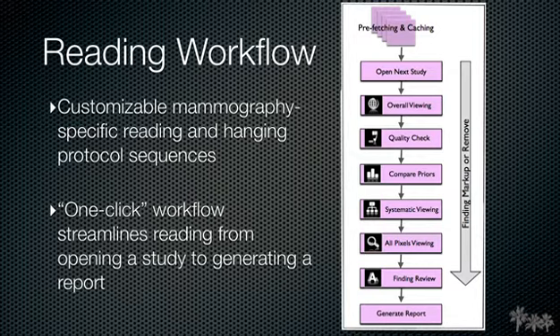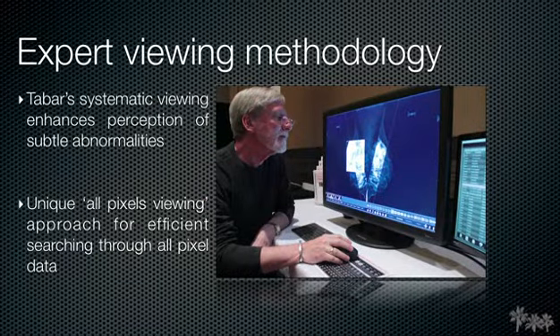WorkstationOne features customizable mammography-specific reading and hanging protocol sequences, as well as a one-click workflow, streamlining your reading from opening a study to generating a report. WorkstationOne features expert viewing methodology, such as TABAR systematic viewing to enhance perception of subtle abnormalities, as well as the unique all-pixels viewing approach for efficient searching through all-pixel data.